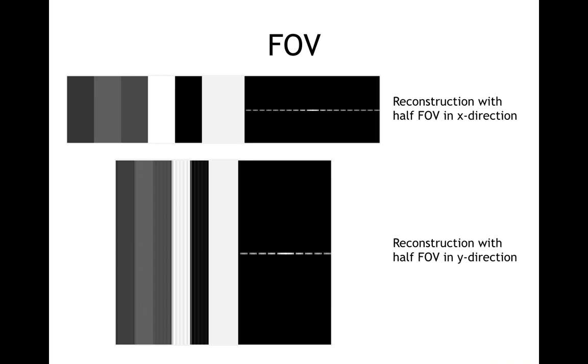Also note that in the below figure, we see an effect of low resolution similar to what we saw in the low resolution reconstructions. This is because when we increase the distance between the samples in the scanning direction, we lose some of the information. The k-space representation is similar as well.